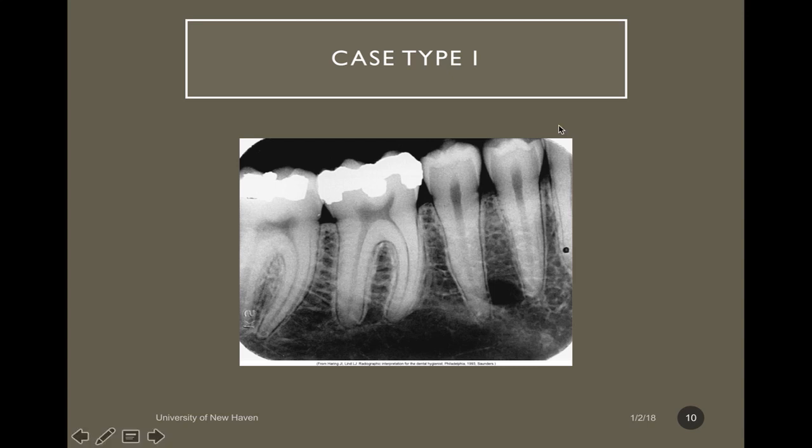When I look at this radiograph, just as a side note, I can see a lot of cervical burnout here. Everyone can see that here, just below the CEJ. That's all cervical burnout. It's a nice image also of our mental foramen.